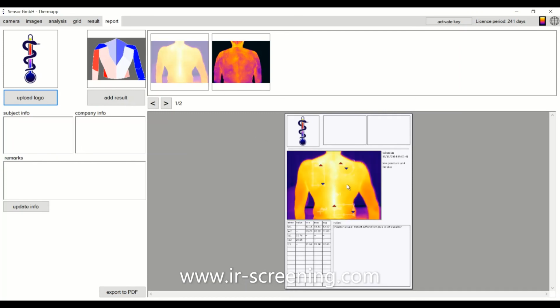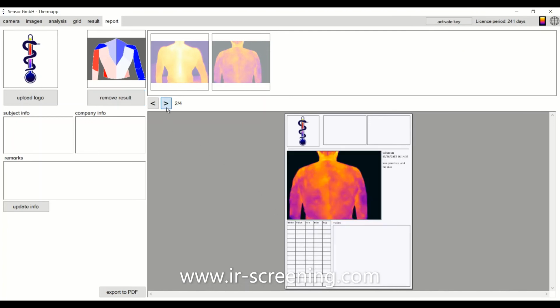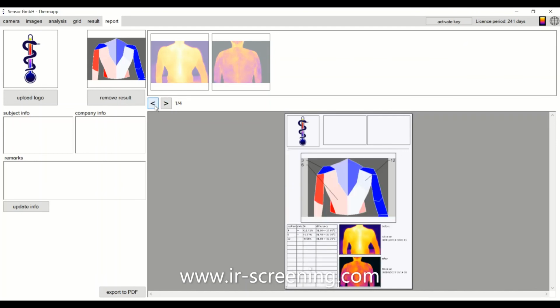like this, containing the image with any measurements you may have added drawn on top of it, any general information you need for the image, notes you may have added, and the data of set measurement zones. If you did a progress comparison beforehand, you can also choose to add this by clicking Add Result. This will create a page like this with the visualization, information regarding any sections you selected, which images you used to generate this visualization, and a separate page for the images used.